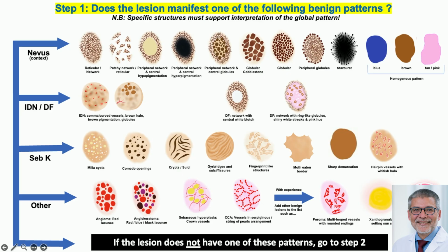The first one of those in the tier is the nevi, and that includes the so-called dysplastic nevi, atypical nevi. I thought, by the way, that last lecture was absolutely spot on and fantastic. In dermoscopy, we start to realize that all of these nevi tend to have similar patterns, whether you call it mild, moderate, severe, junctional nevus. They all share certain morphologic features on dermoscopy, so we don't really use that terminology anymore in the world of dermoscopy. We just talk about the patterns that we see.